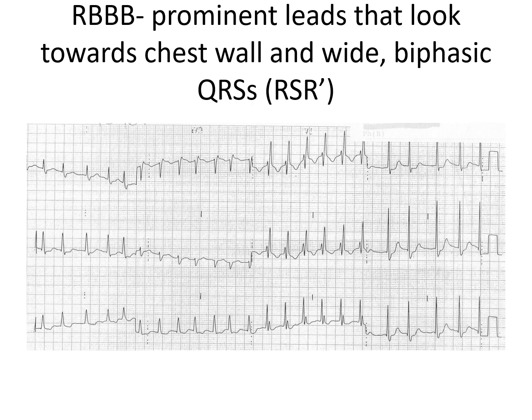Now let's look at a case of a right bundle. Remember again, there is not necessarily an increase in the muscle mass on the right with a right bundle. However, the conduction problem is going to make the right appear more prominent because the overall area under the curve is going to increase because everything is taking longer. The depolarization is taking longer.